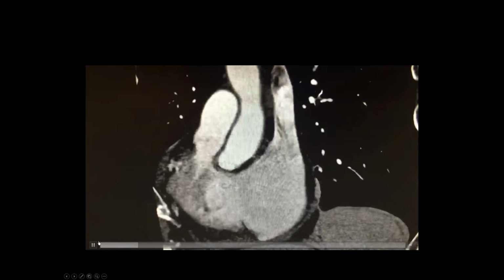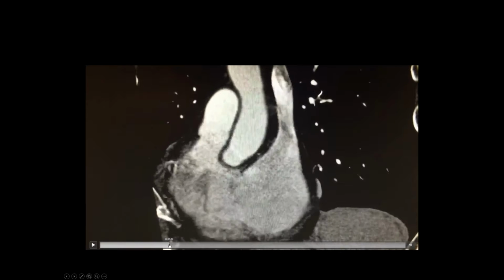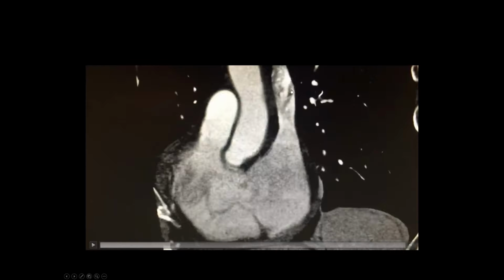And then just to pause it here, these are the kind of things that you see in the superior vena cava all the time. You see dark swirling things, and you're never quite sure if that's a thrombus. So here you can see if we pause it at any kind of level, this could appear as a thrombus. So you never really feel strongly about calling anything in the superior vena cava with a stagnant image. And you can see where this area that could be a thrombus, once you gate it and move it, you can see the swirling, which is consistent with poor mixing and mixing of blood, etc. And this patient actually had a papilloma in this tricuspid valve, which is another interesting finding.